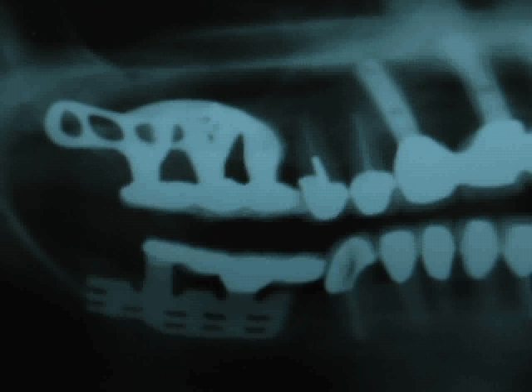This is a case where we did a posterior maxillary custom Endosteal. We did a blade implant and several root forms, and we also did ridge splitting in this case. This custom Endosteal is done without crossover notches, and it was done several years ago. And I think when you see the photographs of the crown and bridge, you'll see that the best crown and bridge came off the custom Endosteal implant.